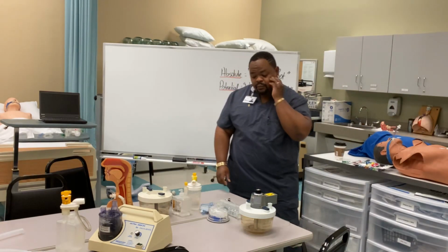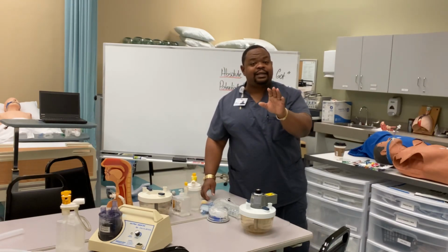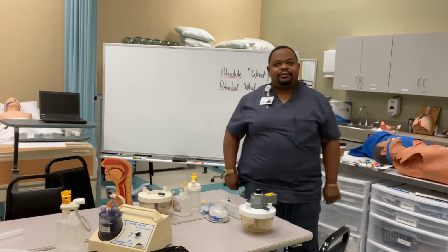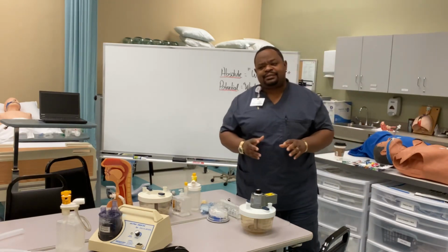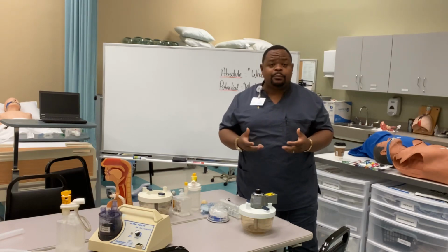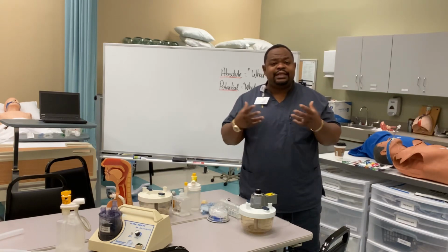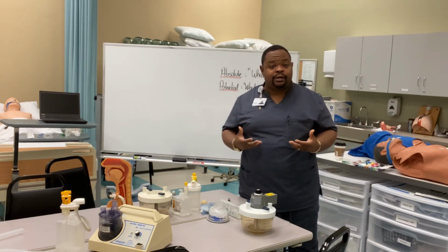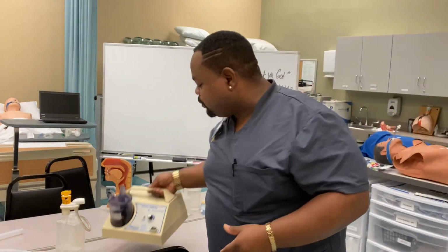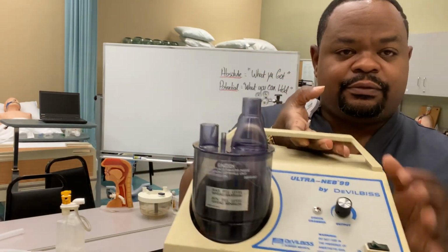All right. The last thing that I want to show you is the ultrasonic nebulizer. The ultrasonic nebulizer is an older device that is used for sputum induction. If I want to get some sputum from you, then I need a machine or a device that can really get a lot of moisture into your lungs. Well, some time back they invented the ultrasonic nebulizer. This is the ultrasonic nebulizer.